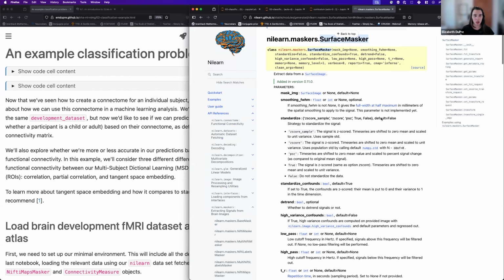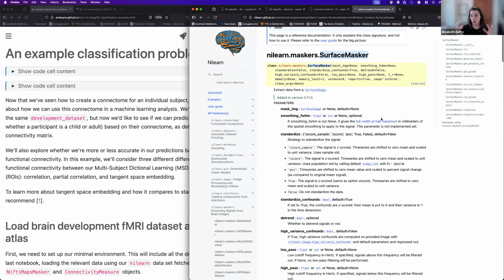So we're now able to treat surface data as sort of a first class data type in Nilearn, and extract, much as the same routine as we did in the volume, extract things on the surface. So it's not, I would say, as comprehensive of support for surfaces yet as it is for volumes, because this is something we've been iterating on, but it is now there. So you can do almost everything I showed you today so far, you can do in the surface as you can in the volume. Yes.